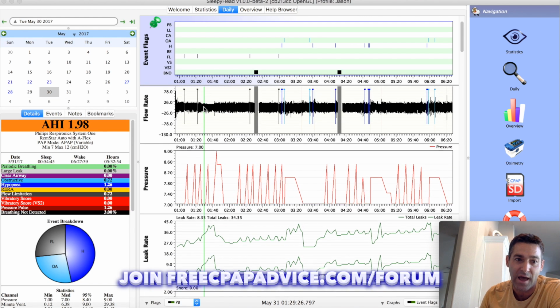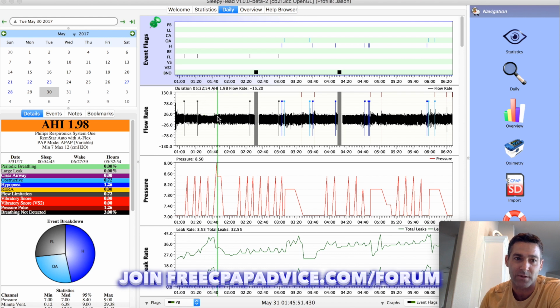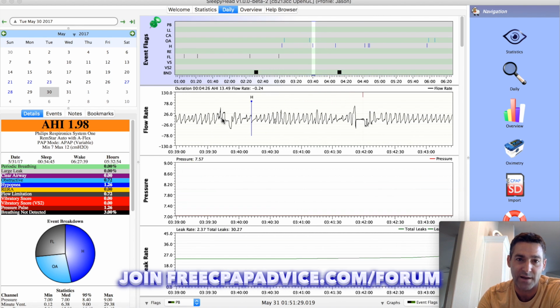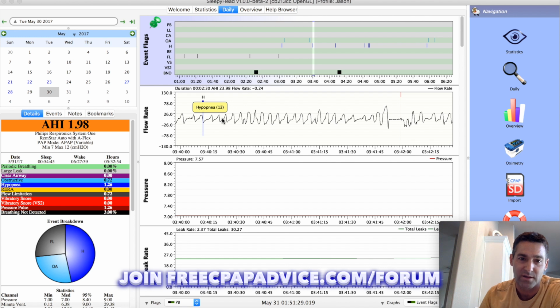In looking at it, it's very helpful to have your flow rate on top. Now, if you were to zoom in to flow rate by pushing on the up arrow, you can get a real detailed breath by breath. You can see the pressure, you can see leak rates, and it has this nice little green line here that can line everything up and make it a little easier for you to see.